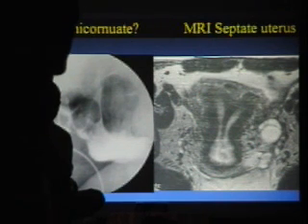What were the tip-offs on this? Perhaps slight irregularity here, and the fact that it's not a very skinny, smooth little banana-shaped unicornuate system going off to the side. But remember that this can happen easily in a septate system where the cannula gets put into one horn. The septate uterus here, as I already said, is almost normal. The uterine size is like one uterus.